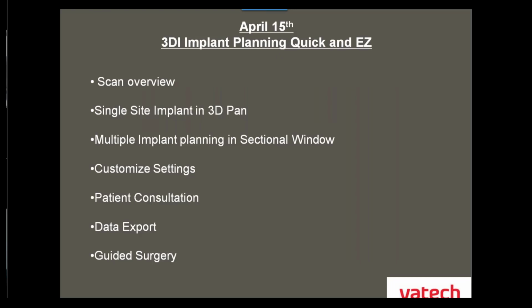Quick overview for today's session. As we've done in the past, a scan overview. Paul and I are going to look at two separate scans. We're going to look at an 8x8 scan. We're going to look at a 16x9 scan.